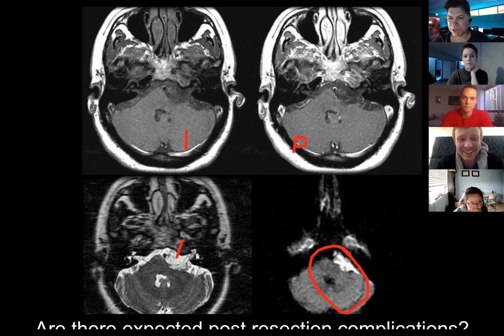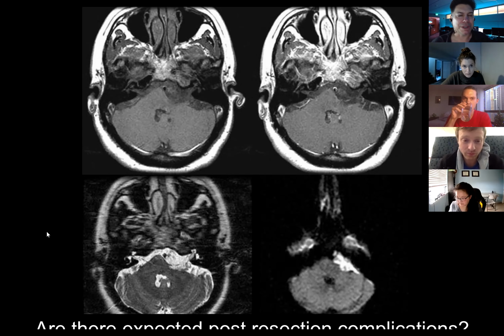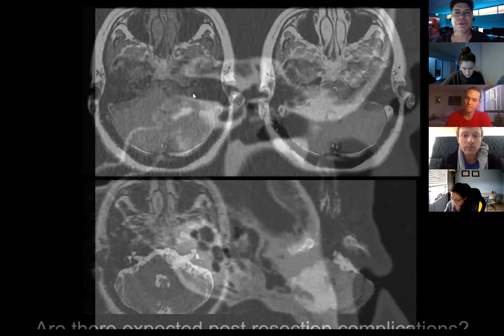Is there a big deal to cut these off, or do you often cut these? Yeah, they can rupture and cause a chemical meningitis, I think. Well, that's usually a dermoid we're talking about, a ruptured dermoid when that happens. But the problem with epidermoid cysts is that they grow around things. So all these blood vessels and nerves are kind of going through them. So often if you cut them out, you have a problem post-operatively if you cut those out at that location.